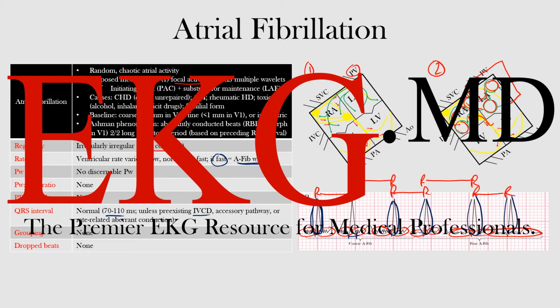And what you would do, remember, when you take an irregular rhythm, you have to count the number. So imagine we have a 12 lead EKG. Here's our 12 leads, our limb and precordial leads. Then we have maybe a rhythm strip or maybe two. And imagine we have lead 2 or V1 present there. What we're going to do is take all these complexes. They're all irregular throughout.